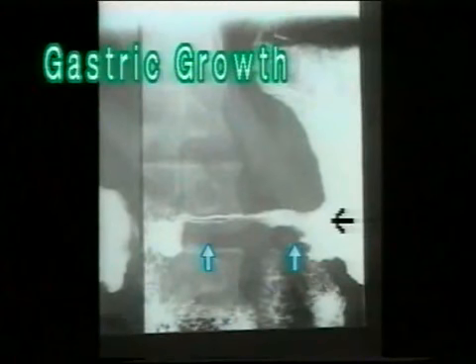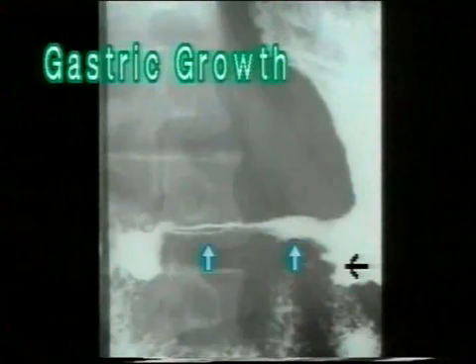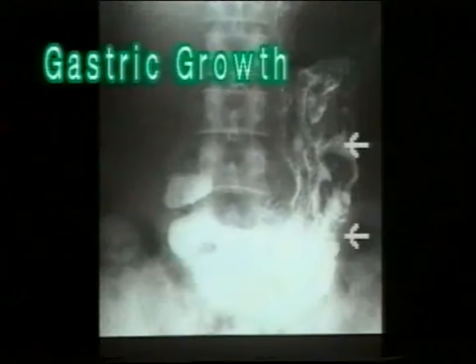This barium meal X-ray shows a growth on the greater curvature in the prepyloric region. Note the irregular long narrowing of the distal end of the stomach. The arrows point to an irregular radiolucent projection of the growth into the barium-filled lumen. Also note the shouldering.